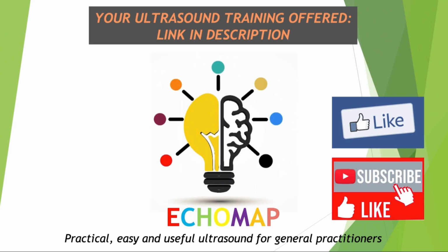How does an ultrasound machine work? Why do we get this type of image? By really understanding how the ultrasound machine works, and by really understanding specifically why some images are actually false images, we avoid falling into these traps. And that's exactly what we're going to cover today in this video.